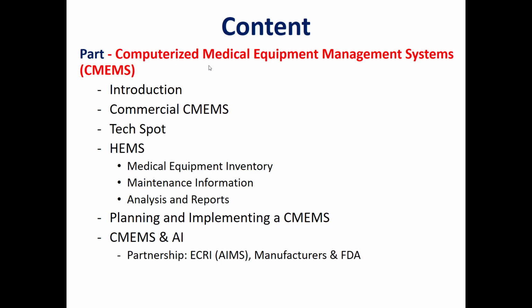This is the second part of the Computerized Medical Equipment Management System, or CMEMS. In this part, we'll have a practical example to demonstrate what a computerized medical equipment management system is. This example will be about the HEMS system, which is developed by the EQ2. And we will cover these points.